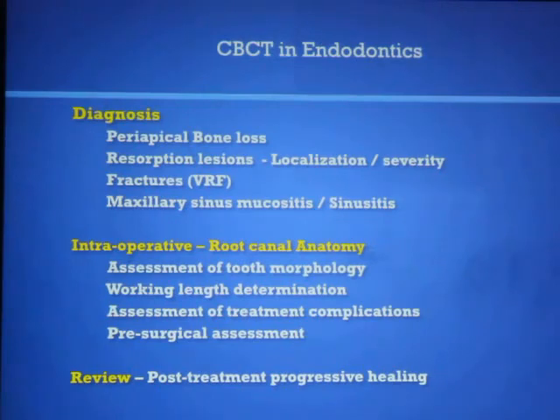So next we are looking at the use of this conebeam CT scanning in different applications of endodontics: for diagnosis, for the intraoperative procedures, and the reviews, and we'll look at each situation with examples.